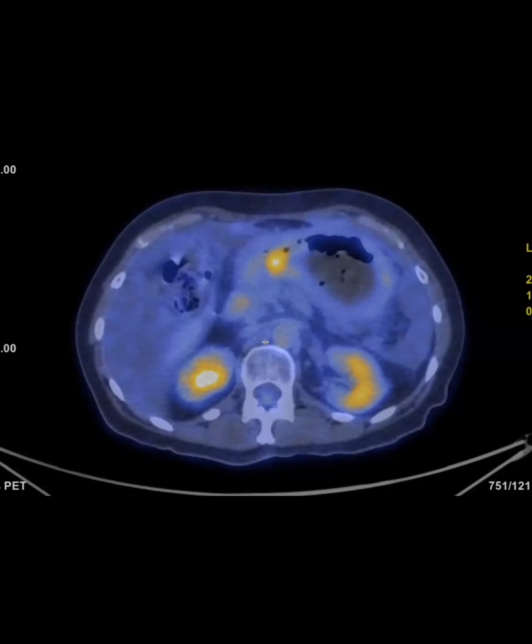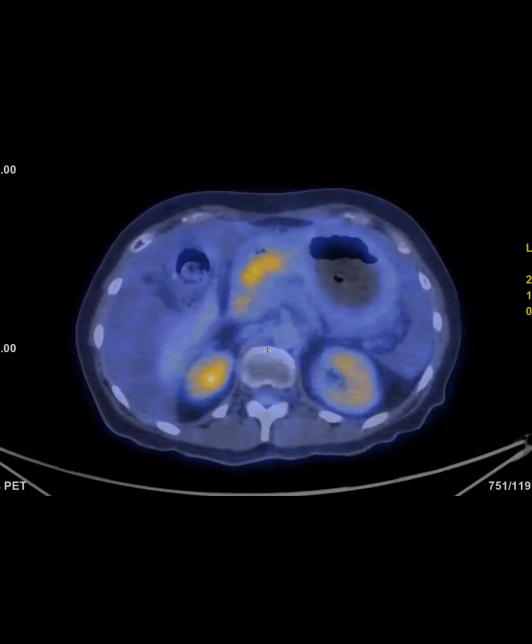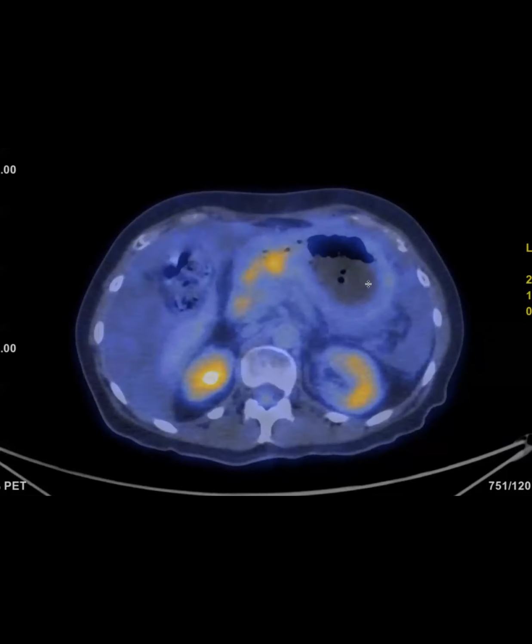Yeah, like I said, the initial treatment was several years prior, and these are the post-treatment exams that we're looking at. So it's a great illustration of how diffusion on MRI can be really, really effective. Yeah, diffusion is a good test.